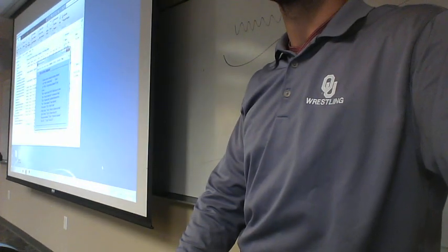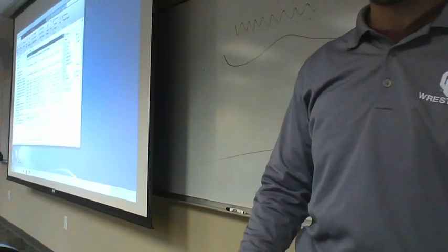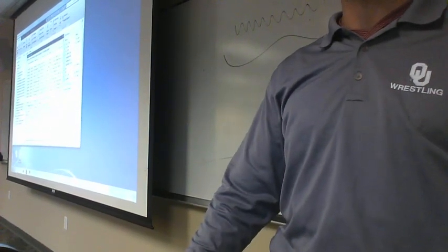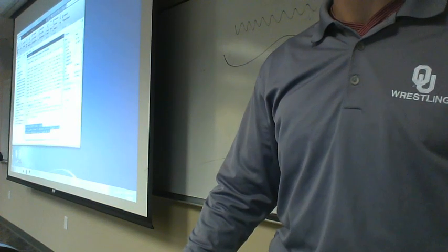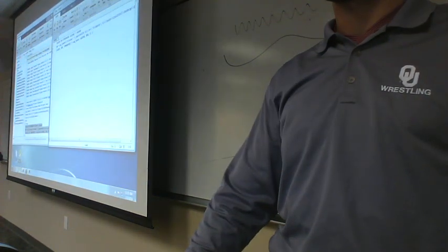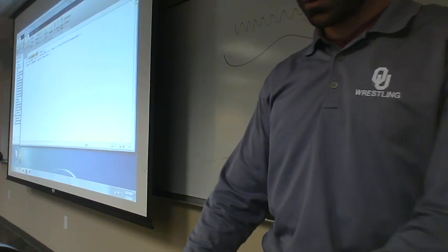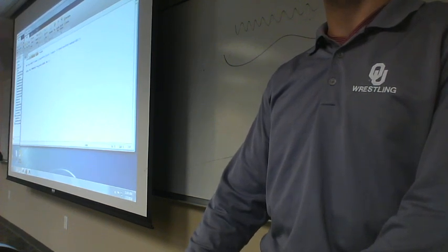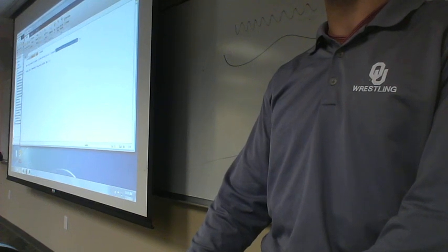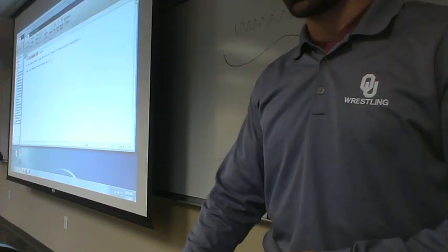Okay? So I just loaded it in. We can revisit that. I can just type EEG in, and all it does is show that one simple thing that I did. New script, paste. All I did, I just typed EEG Lab. I loaded in our file. It says what our file name is, what our file path, our directory is. And this just shows that it's rebooted back up, so it's ready to go.